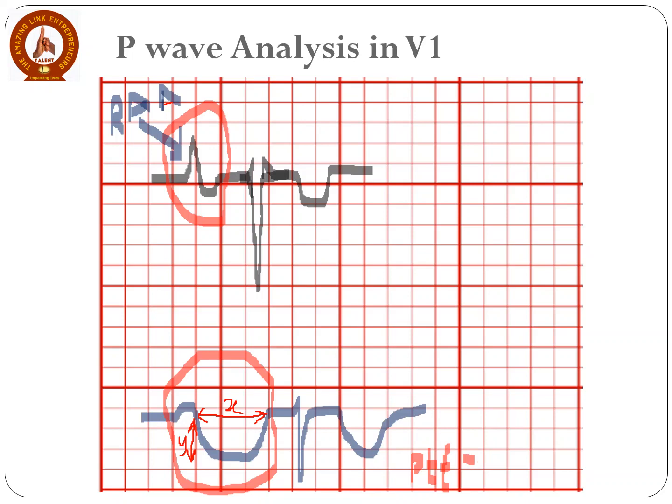This is greater than or equal to 0.04 millimeter seconds.